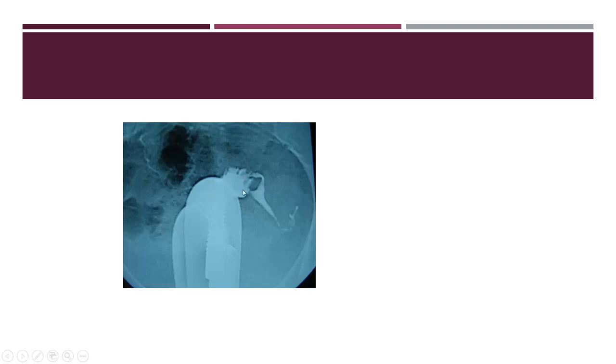There is endometrial glands. And on doing ultrasound, this is a magnified view. This is not a normal cervix. This is the internal os. And this is the uterus appearing in an abnormal position, pushed out by this cervical lesion. In this case, they told me that the contrast is coming out and they could not do the hysterosalpingography.